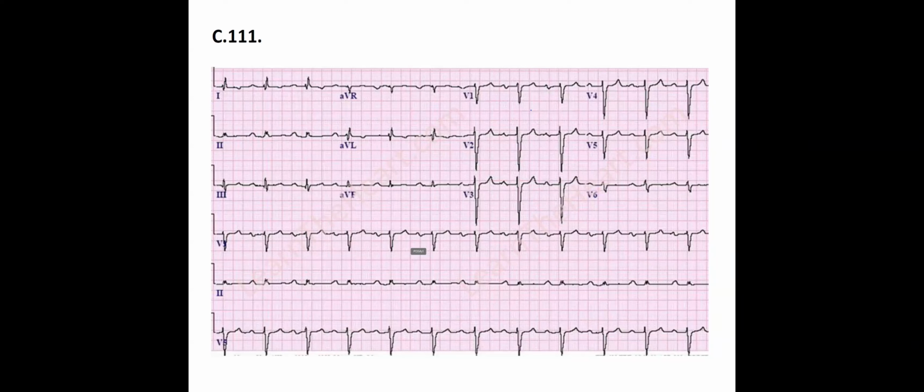First of all, if you are looking at lead number 1, it could be a little bit notched. I cannot say that it is not a left bundle branch block, but that's an incomplete left bundle branch block. But what else can you see besides this incomplete left bundle branch block? Maybe a prolonged, like longer PR interval? That's it.